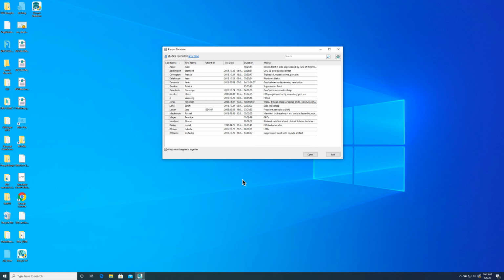In this video, I will be doing a short demonstration of Persyst 14, the latest version of our software. This demonstration will be done using a standalone version of Persyst, although frequently you will be using Persyst in an integrated fashion with the EEG manufacturer's software.